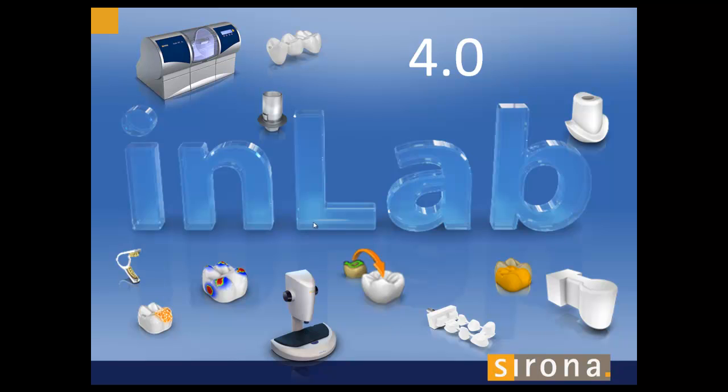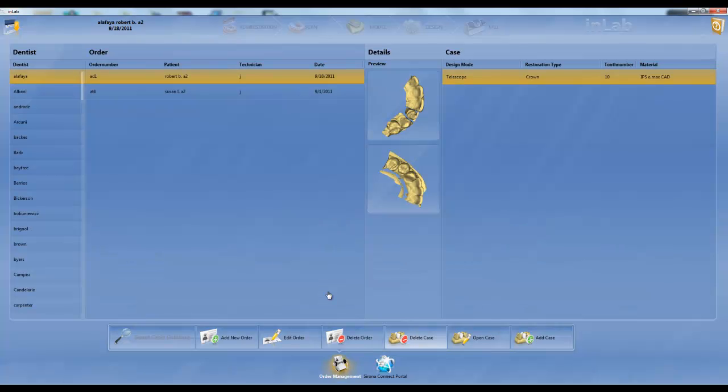In this initial webinar, I want to briefly walk you through the new layout, go over the types of restorations you can do with different design modes, introduce you to the new tools, and really just show you where everything is located so you can get started right away. In future webinars, we'll go into more detail with multiple unit designs, abutments, multi-layer, and many more features of this awesome software. So let's go ahead and get started.